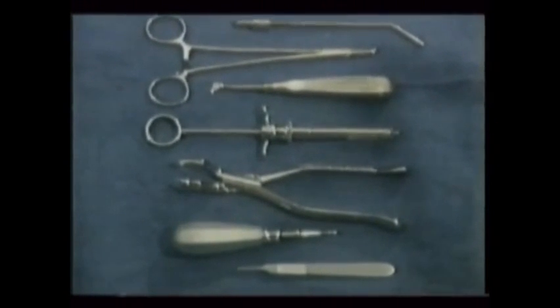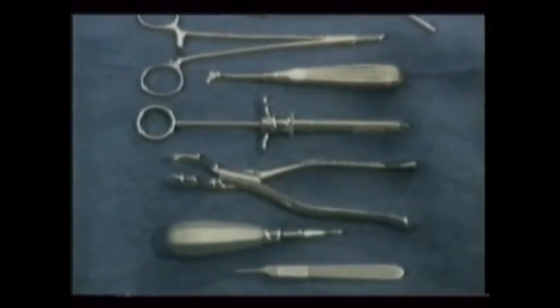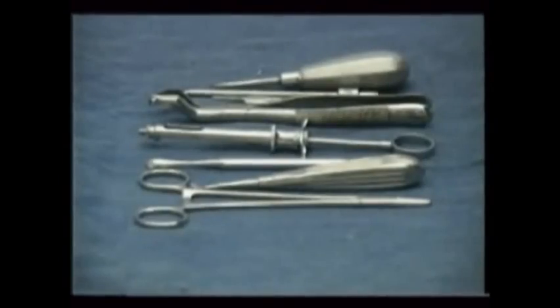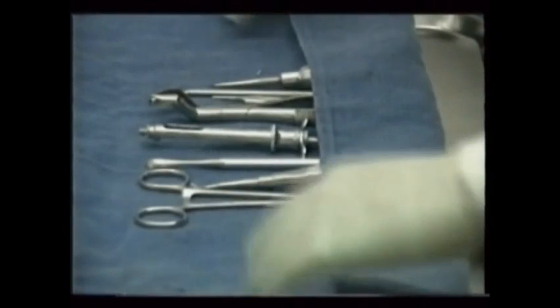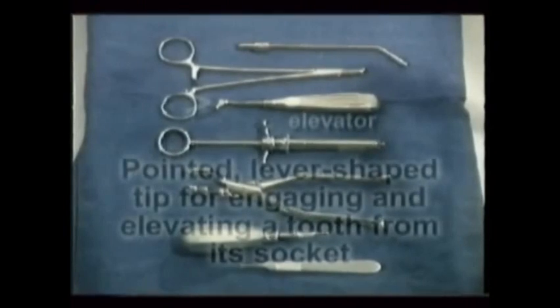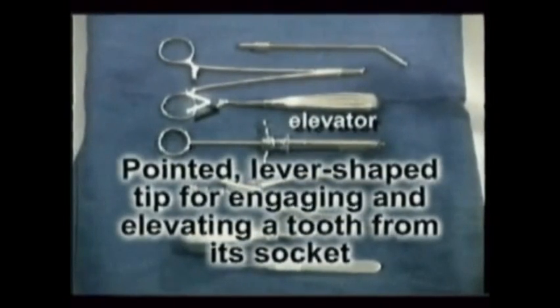The instruments that we use in oral surgery can be very intimidating, not so much to you, but maybe to the patient. Remember to keep all of them out of sight until they are used. While the various shapes and sizes may seem confusing to you at first, think about what the instrument is intended to do. What you seek for a certain procedure will soon become automatic.